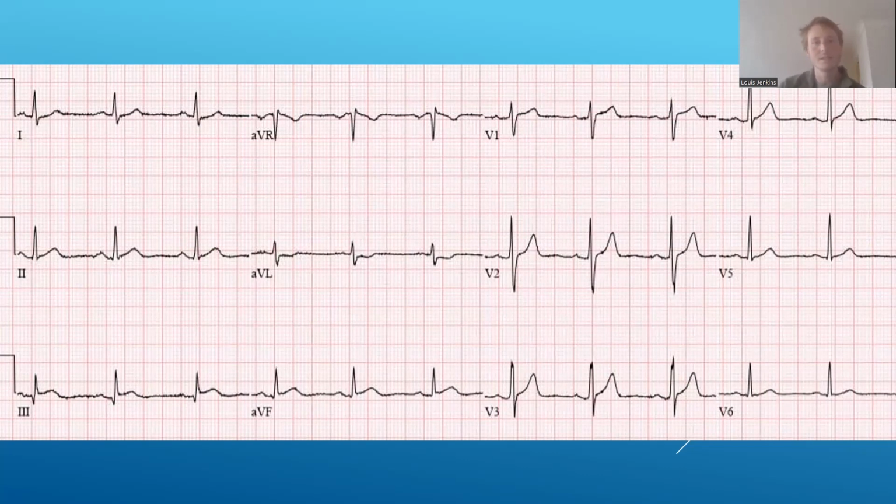So when I'm looking at an ECG, I like to look at the overall ECG first. There's a really great cardiologist on YouTube, an electrophysiologist actually, called the ECG Doc, and he talks about looking at the forest before you look at the trees. And I think that's a cool point, and that's something that I tend to do. I think what he means by that is the forest is the overall ECG, just having a bit of a general vibe before going down and looking at the nitty gritty. And when I look at the forest of this ECG personally, I'm actually not that alarmed.